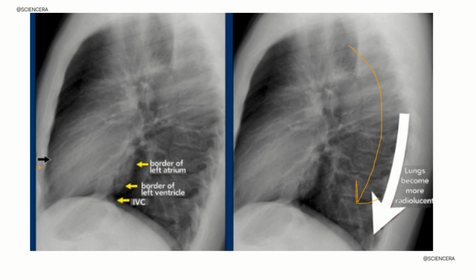There is air behind the breastbone, the sternum, and it looks quite dark on the X-ray. Then we said that they can see the shape of the heart and where the big veins enter the heart. Here we can see, and then they can see the borders of the left ventricle and the borders of the left atrium.